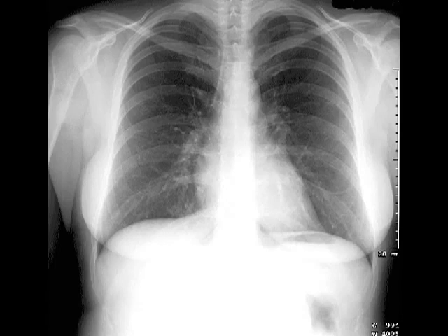Patients are asked to take a deep breath for a chest x-ray to fill the lungs with air and expose as much of the lung tissue as possible. A good breath is one that exposes, as the diaphragm drops down, 9 to 10 ribs. So you can count them to see if the patient was able to take a deep breath.